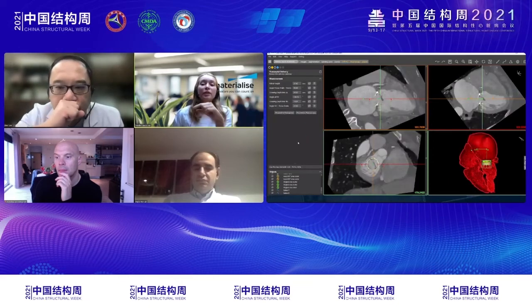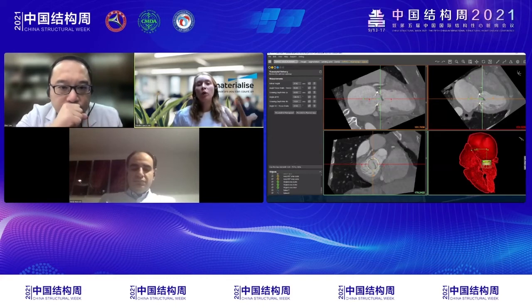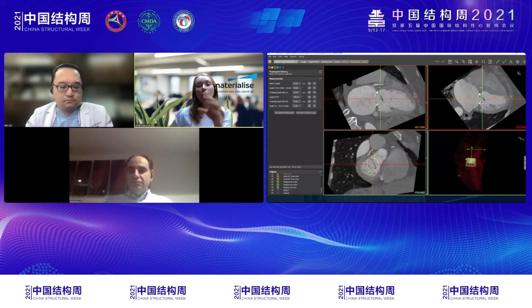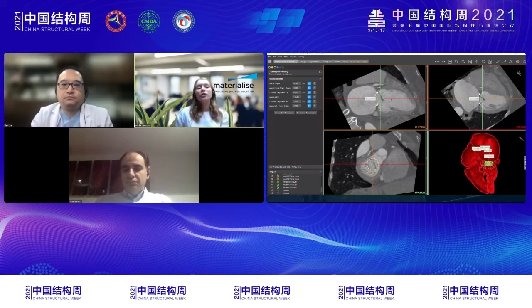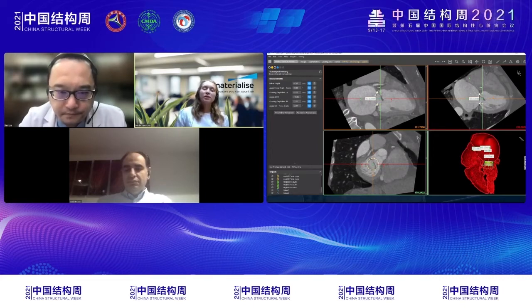So in delivery, nowadays, we can offer you a lot of measurements and angulations, but the question is still there, what is useful for you as a clinician? So mitral height is one of them, but I want to point out to you what you can do in delivery. You can play with this curve, and then you see the measurements pop up. So I'm curious here also about the comments you have on delivery and what your opinion is on what is needed in pre-planning there, because I believe it's very clinician specific also.